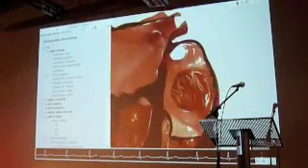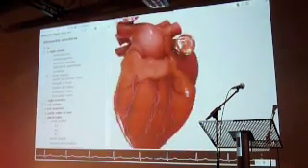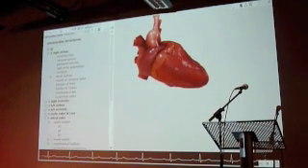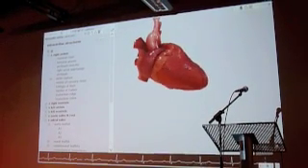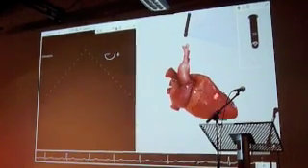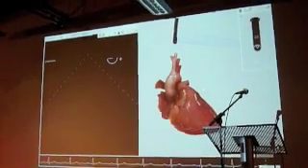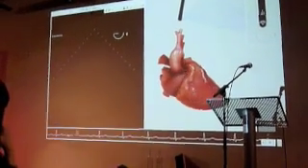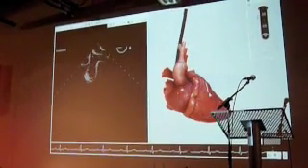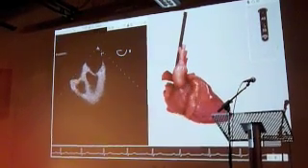Now obviously really the last aspect, or the key aspect of this, which is what we set out to do in the first place, was to simulate ultrasound of this heart. So if I bring up my simulated ultrasound panel and show my simulated ultrasound probe, now my probe is currently sitting in the esophagus above my heart. Now, using the software, I'm actually going to push the probe down, and as I push it behind the heart, it starts to generate simulated ultrasound output.